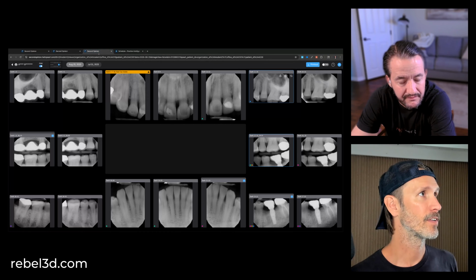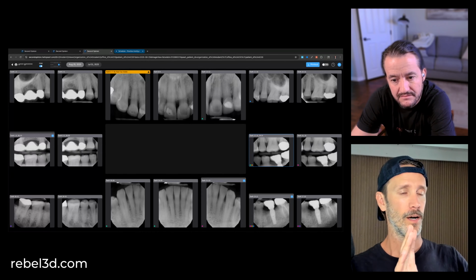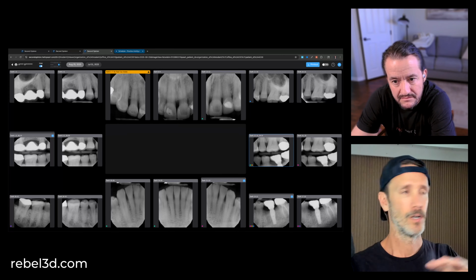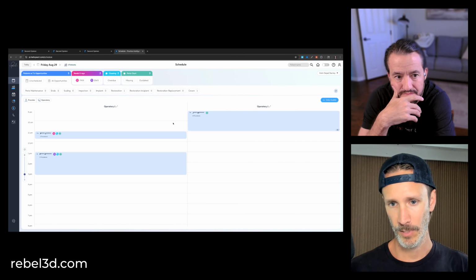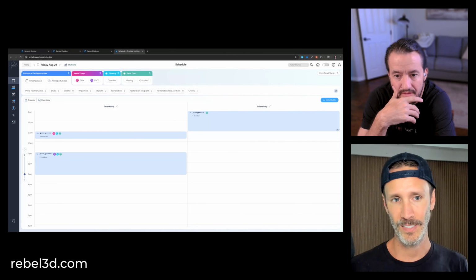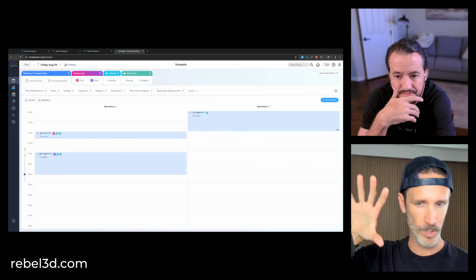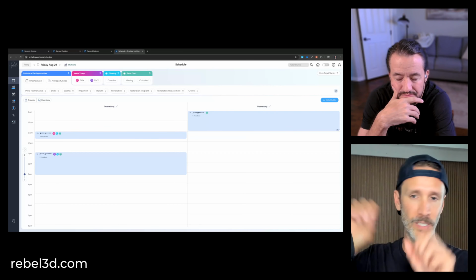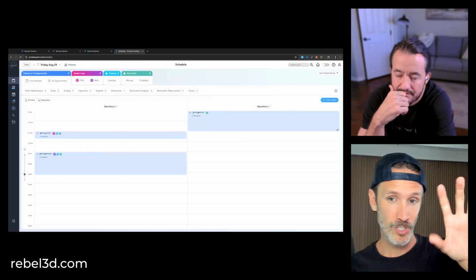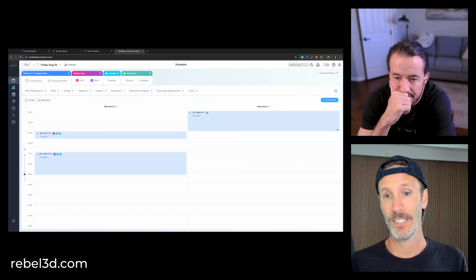And then the thing that I didn't show you is this is just living in your imaging sensor software or in the Pearl software, but you can actually cross-reference it into your practice management system too. That's something called practice intelligence. Second opinion takes everything and puts the overlays on, assists you in diagnosis, shows you the different colors, the measurements, the data. But then what practice intelligence does is it takes all that information from your radiographs and cross-references it with your practice management system.